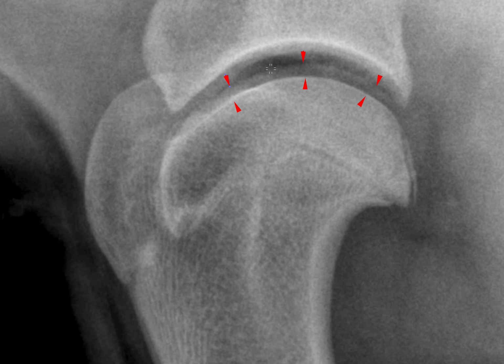This joint, however, is full of something that is less opaque than soft tissue. And if you go back to basics, there are only two things on radiographs that can be less opaque than soft tissues or fluid, and that is fat or gas. Now, it doesn't make any sense to have a joint full of fat, so we are pretty much left with only one option. So this joint contains gas. This is what we call vacuum phenomenon.